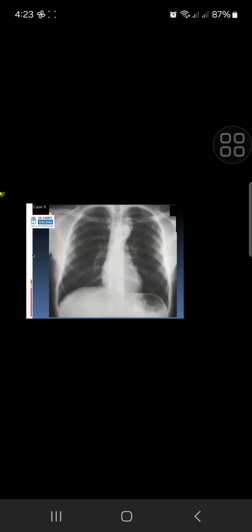Is there any relevant history with regards to this patient? Have you seen rib notching? Yes, I have. Is there rib notching in this? So how's the posterior margin, posterior rib on the left side? The 1, 2, 3, fourth rib, left fourth rib.